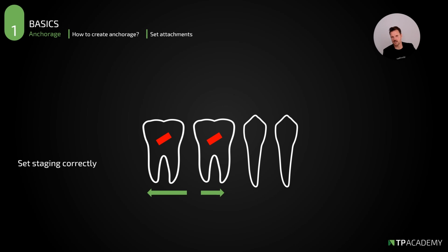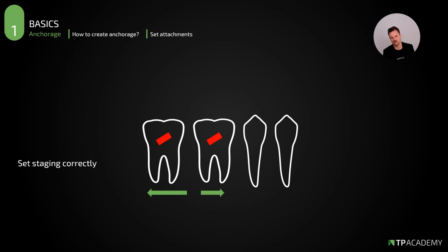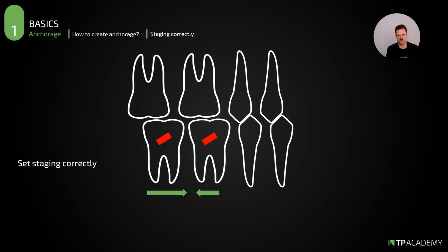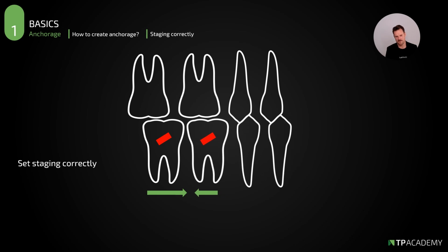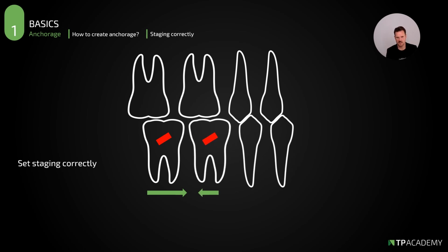And especially when it comes to an anterior posterior correction, an AP correction, what we can see very often is that the staging pattern is not 100% perfect. It is okay, but sometimes it is too simultaneous, as we can see here. And at the moment, we can see there is one tooth we like to have as anchorage, and we move more than 2 teeth at the same time. And at this moment, 100%, we will lose anchorage, and we need to be very careful.